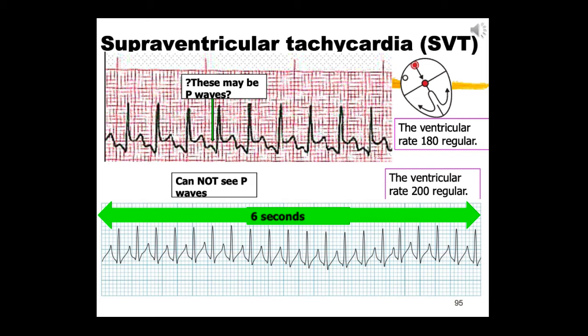We know, because the QRS complex is narrow and upright in lead 2, that it is predominantly going to be either atrial or junctional in origin. The rate is too fast to be a sinus rate, and the complex is too narrow to be considered ventricular.